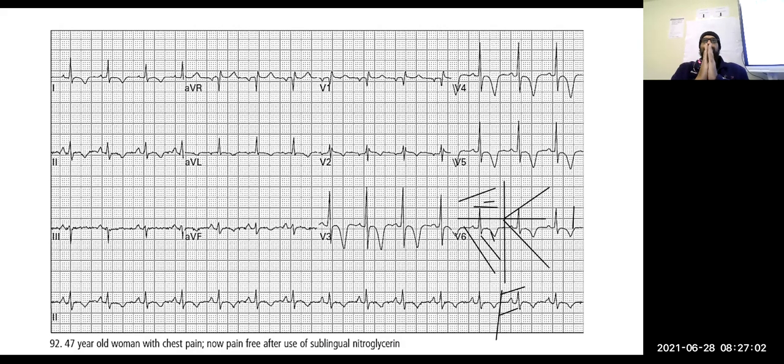Okay, so imagine now I'm lead AVF. What's happening when you see biphasic? What it means is that for a while, lead AVF is following electricity coming towards it. And then at a certain point, it sees it going away from it, all right? So the only way that can happen is if it's perpendicular to how the electricity is flowing. Do you get what I'm saying?